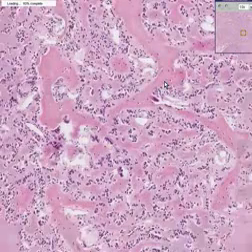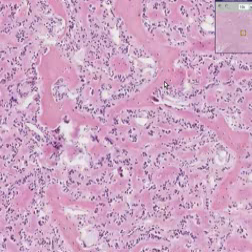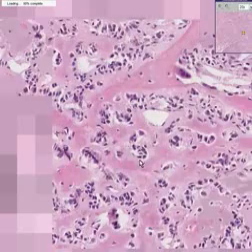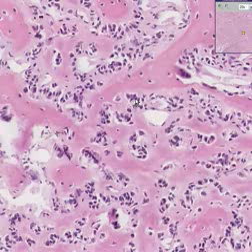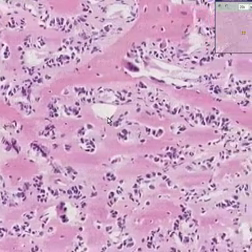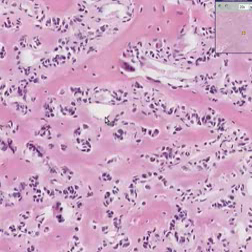This is a classical appearance of an osteosarcoma, more commonly called osteogenic sarcoma, in which you have very small but primitive looking tumor cells, perhaps an osteoclast over there, which are not only destroying but perhaps producing a new type of abnormal bone. Osteogenic sarcomas are truly malignancies of bone tissue for this reason.